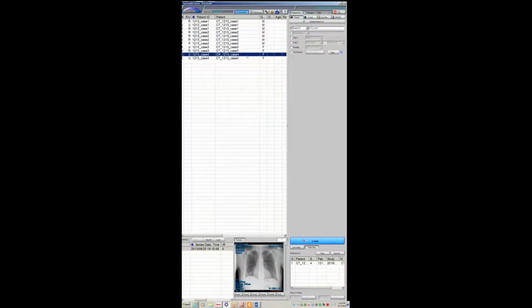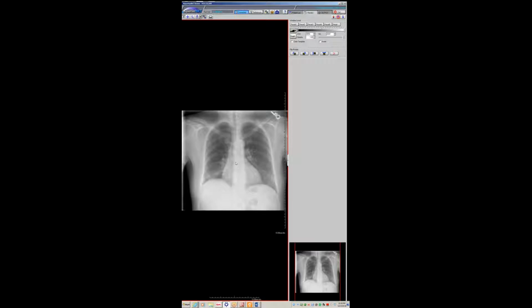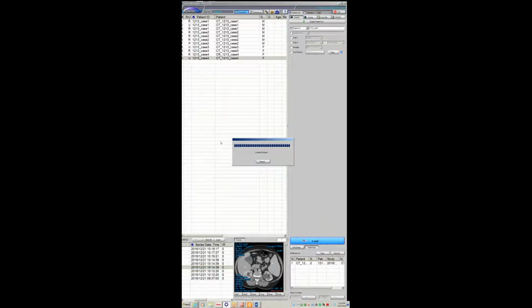Great example. On this one, sadly enough, even though it's absolutely massive, I would hopefully make the diagnosis on chest x-ray, but in retrospect, knowing where the abnormality is, I don't know why this doesn't show it. But there's a big mass back here, which isn't showing up. Just one of the bigger examples of this I've seen.